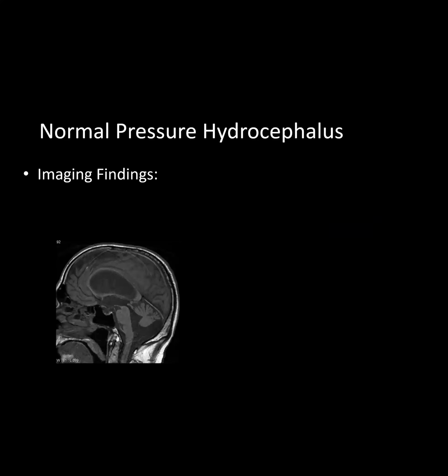And let me just keep going on here. So MR, one thing that you might look for when a patient has hydrocephalus of any cause is enlarged ventricles, and on the sagittal image, you might see thinning of the corpus callosum. If you look at the anterior third ventricle, it's normally pretty pointy on a sagittal image.